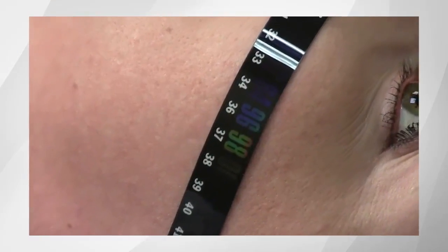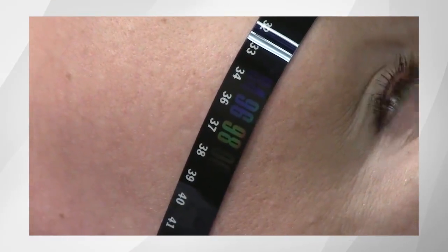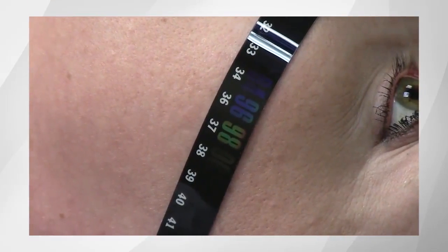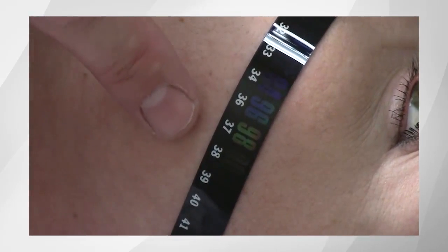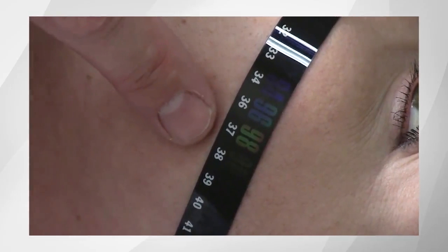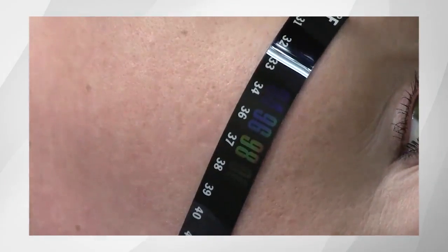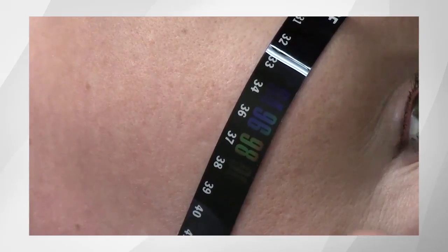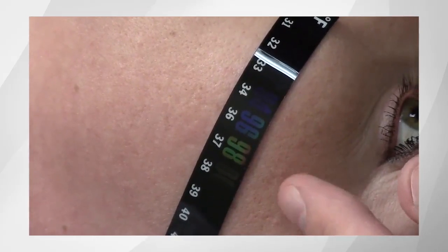If the patient was symptomatic before the procedure and experiences significant resolution of symptoms, the biologic validation metrics are not essential for verification of procedural efficacy, but should still be documented for billing purposes. If, however, the patient was asymptomatic prior to the procedure, failure to demonstrate at least 3 degrees of temperature increase requires repeating the procedure on any side failing to achieve such a temperature increase.